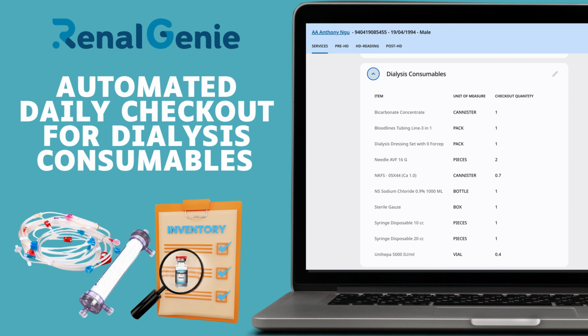This tutorial is about the new features of automated daily checkout for dialysis consumables on RenalGenie.